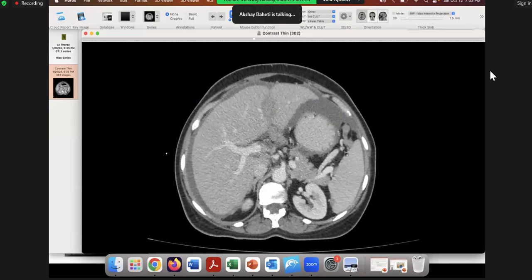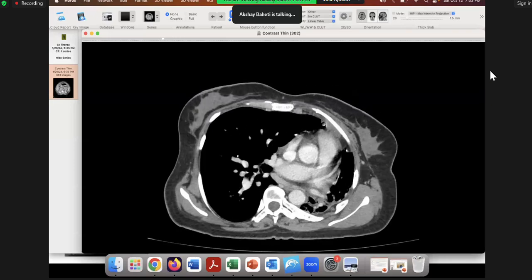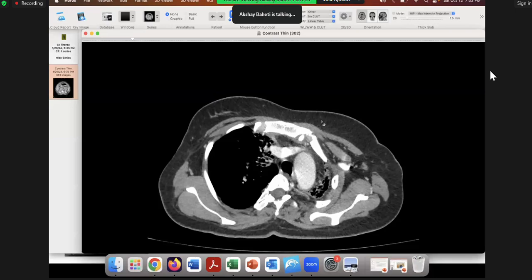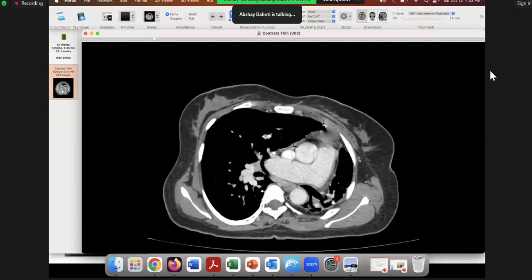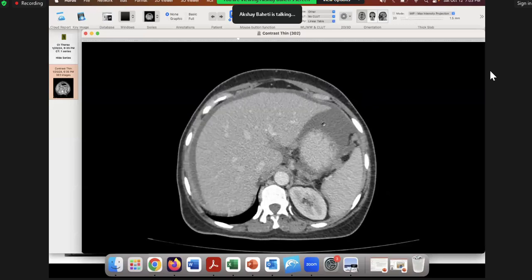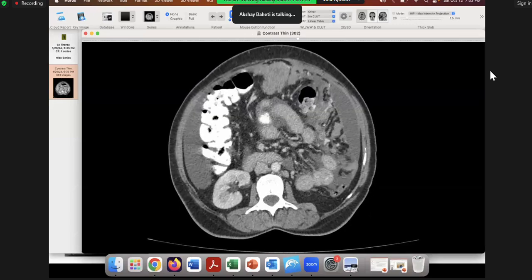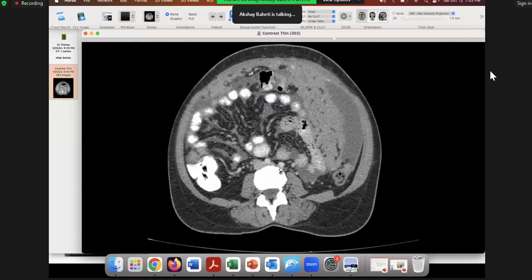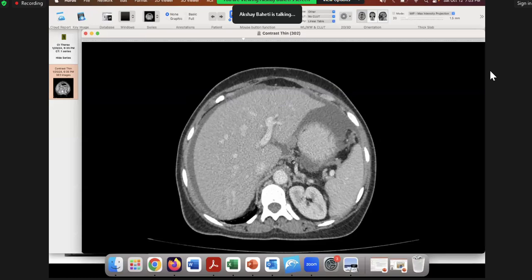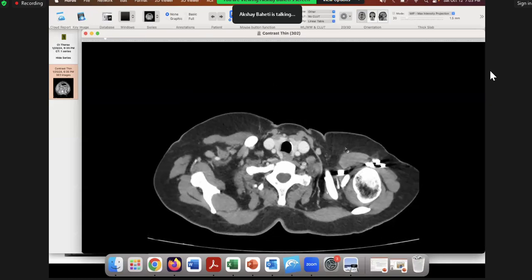Okay, so this is basically a patient, a 50-year-old lady who has a distended belly. She comes for ultrasound. We see essentially a lot of ascites and omental nodularity, fat stranding. The CA-125 is highly raised. Okay, so this is essentially ovarian cancer, right? Okay, so you can see the adnexal masses. So the diagnosis is not the question here. It's just about how would you report such a scan? What do you search for when you report ovarian cancer?